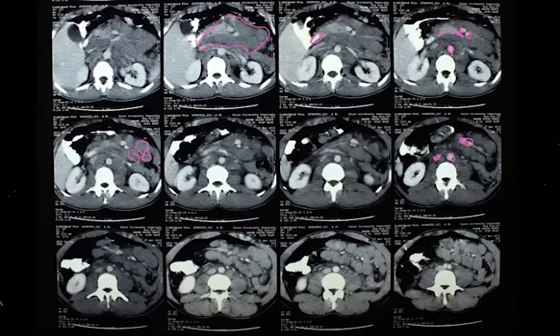We didn't see the spleen in this film. Maybe if we had seen higher films, we might have seen it, because these films are low. But there is no spleen in these films. If we go a bit higher the spleen may be there, but in these images I cannot see it. I'm only talking theoretically. Let's see the next one, Aisha, please.